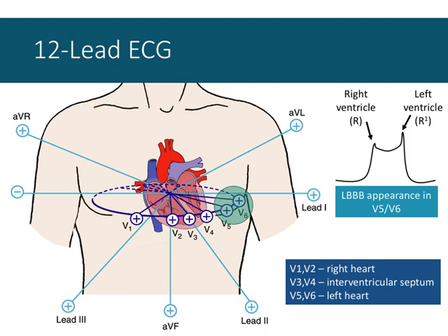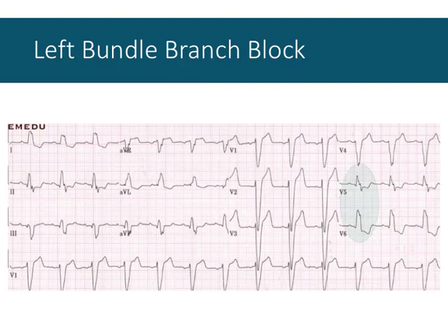So we see this last lateral wall depolarizing coming towards V6 or V5, depending on the rotation of the heart. That gives this horned or notched or bimodal appearance. So we can see that here.